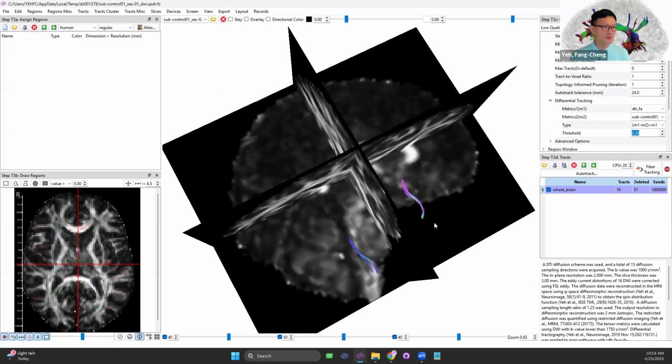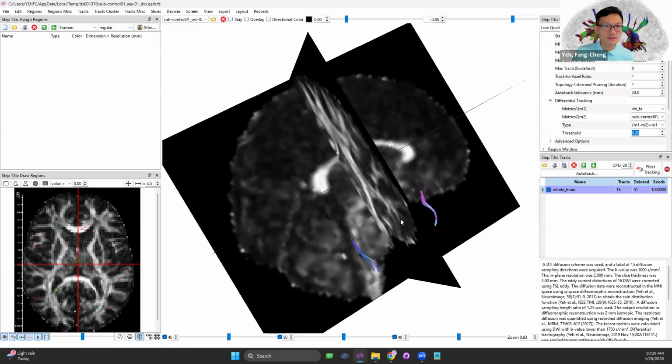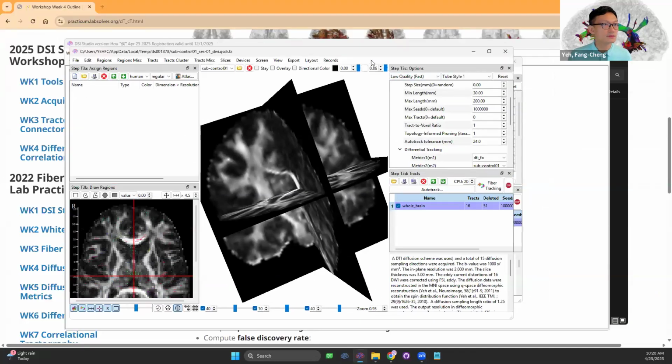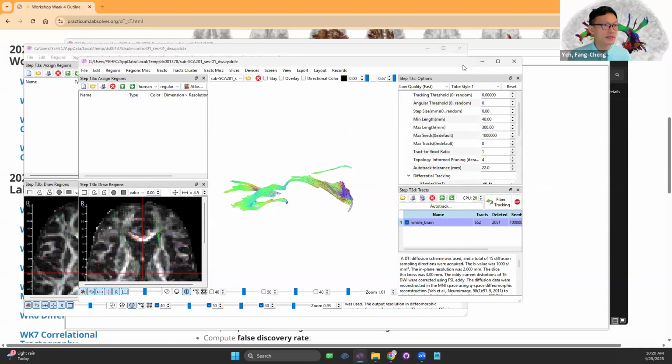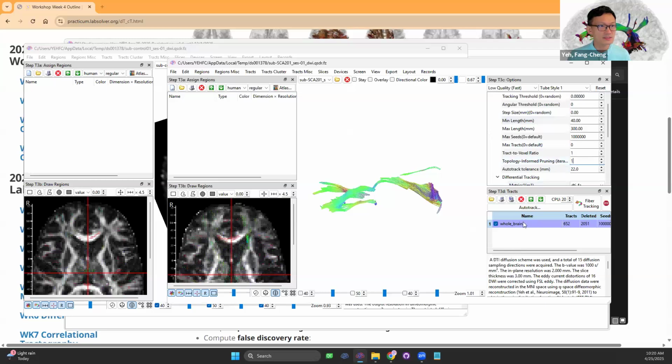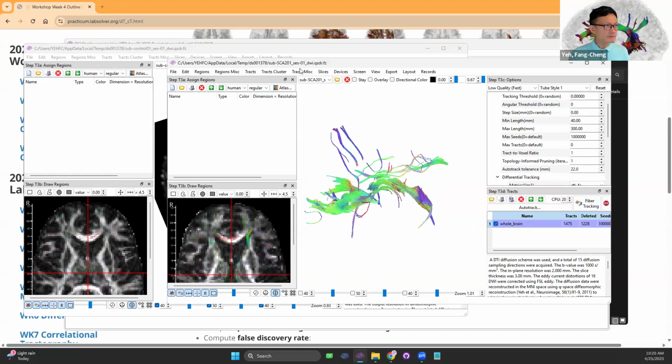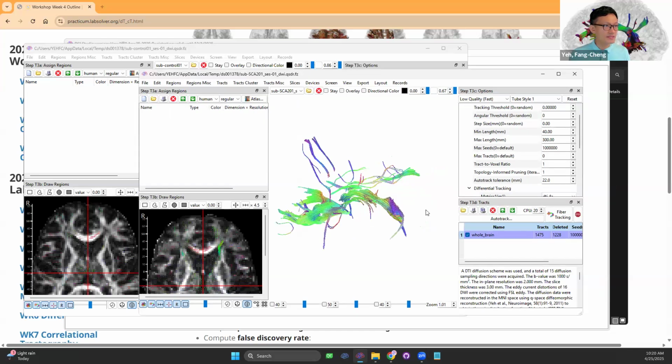And we will usually treat this as a false discovery, in the sense that this subject is a control subject. And then if we compare this with this, we set all the parameters the same, and we get a lot of findings in the patient, then most of these results would be true.